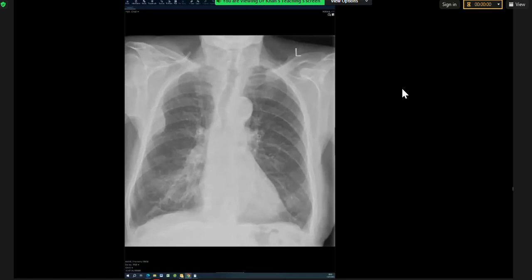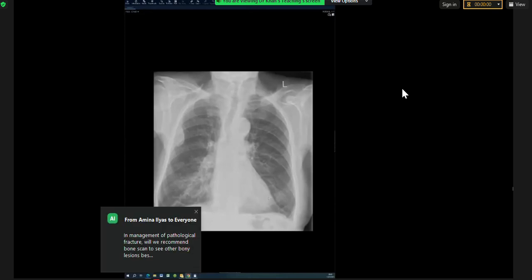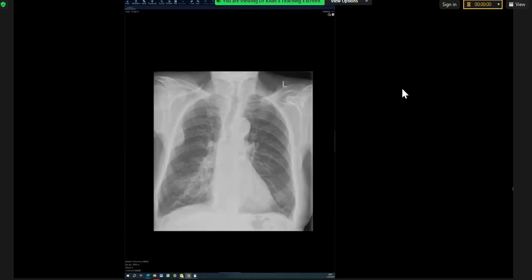Is the lower right vasculature on this chest X-ray normal? Yes, it is normal. This one on the screen right now, this is normal. With age, you get this sort of blunting of the diaphragms bilaterally quite commonly. But like the last candidate said quite rightfully, you have to say it could represent small pleural effusion, but this is just common pleural thickening in elderly patients. This right lower lobe vessel can look quite prominent in many people, but this is normal.